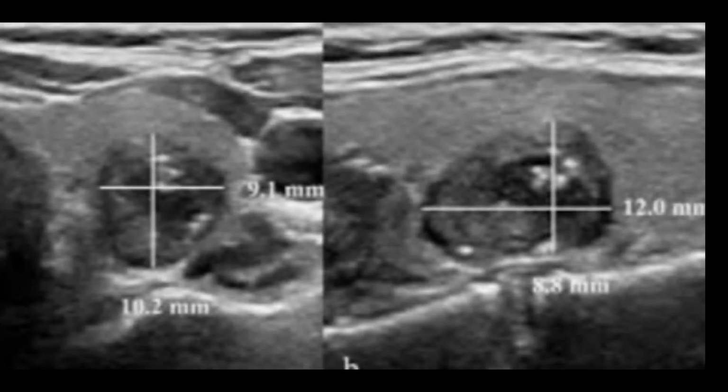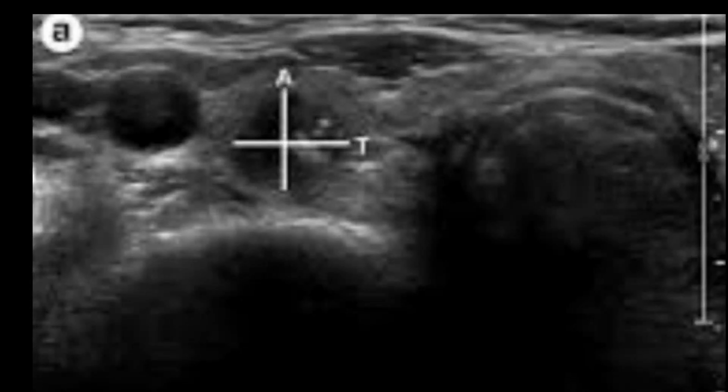So always concentrate on its length as well, its diameter, its echogenicity, its calcification and its outer margin. When you see any taller nodule, it would be classified as a U5 malignant nodule. To explain it more thoroughly, have a look again. This is a nodule.